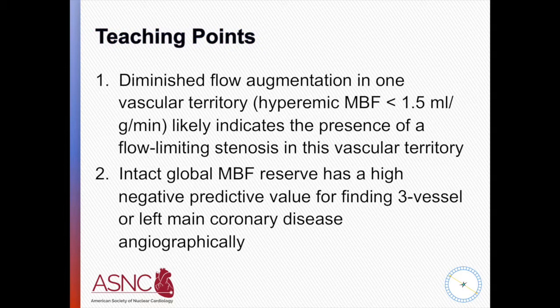Great. I like your number 2, actually, because we see so many people today who have a known chronic total occlusion. So one vessel is completely occluded, and the question that is being asked of us is is there a second or a third vessel that's diseased? And, of course, that is very difficult with nothing but a spatially relative myocardial perfusion image to look at, such as what we have historically been doing with SPECT. Predominantly it comes down to what is the blood flow reserve in the remaining 2 territories that helps us to know whether there's a problem.